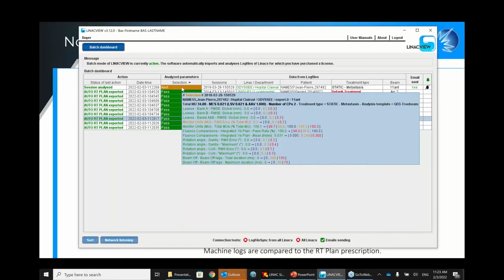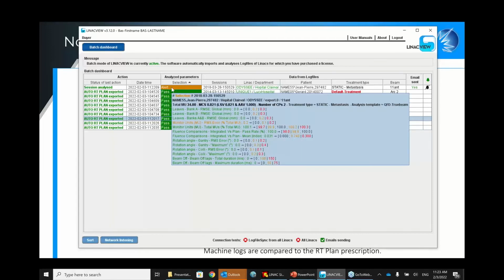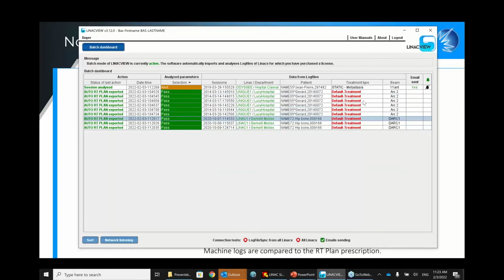I didn't have the PDF report attached. You can choose to have a detailed PDF report attached to the email as well. So you don't even have to walk over and log in as a higher level user to review the issue. As well, this particular plan has a tag so that it doesn't use the default template.